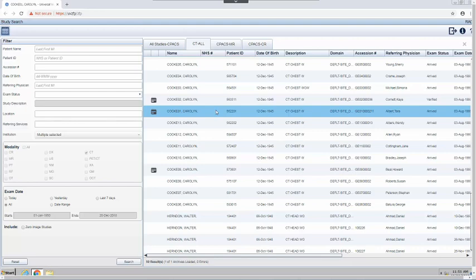There are several default displays for opening a study. The default display used by ZFP depends on the information available in the study. When a study contains a report or clinical document, key image notes, and images, the document notes display on the left half bottom of the screen, and the key images display on the right half top of the screen by default when the study is open. In multiple monitors, the report and clinical document or notes will display on the left monitor.